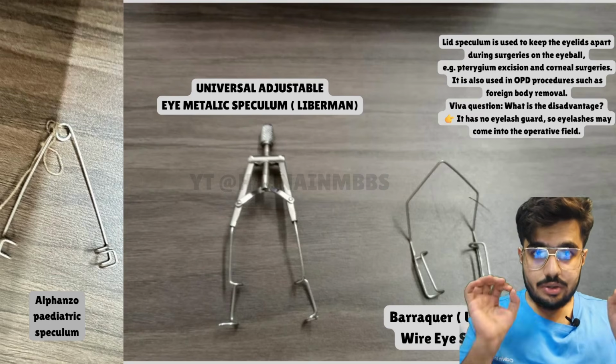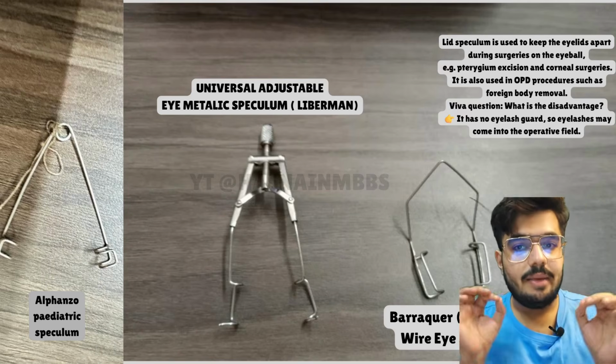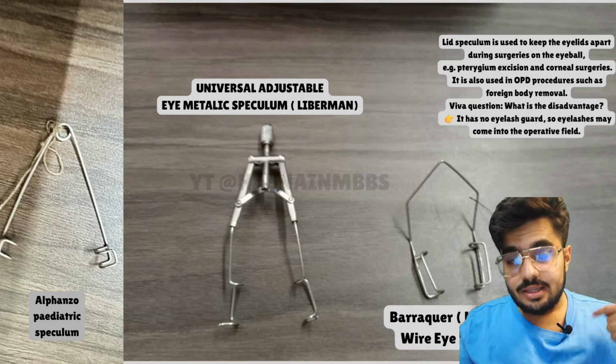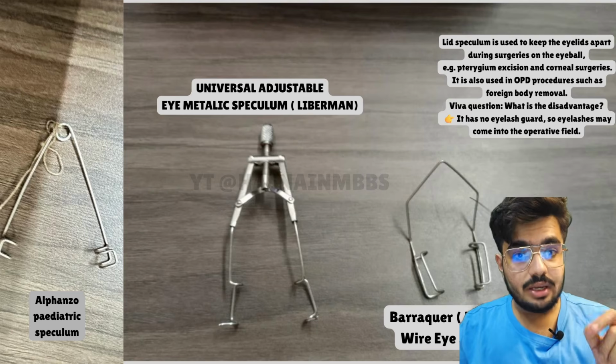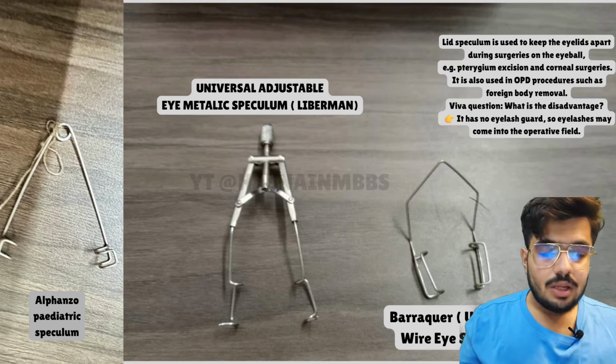Just give the basic name, like metallic eye speculum or wire speculum. Then if the examiner asks you the exact name of this speculum, then you can say Lieberman in case of the universal or Barraquer. So try to keep your viva very simple.